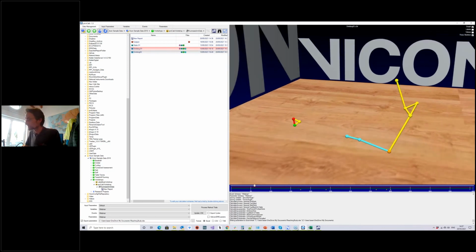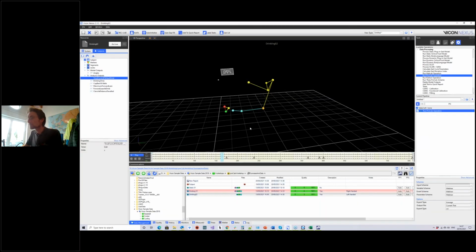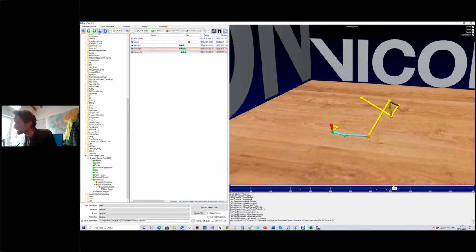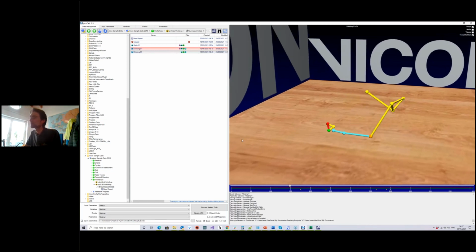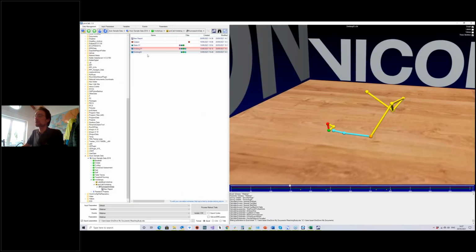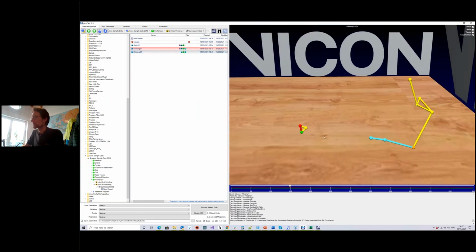Now I've opened 02, but since I saved out the, oh yeah, sorry, so you see all the 5 events here. One appeared almost behind the 400 number here, so I didn't see it at once. But what I could do is clear these events from Polygon, from Nexus, resave it, and have another look in ProCalc.